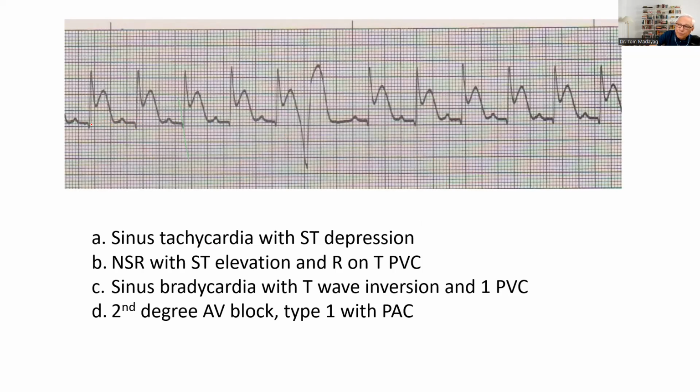But in inspecting the ST segment, we note that this is above the baseline. And again, the baseline is right over here, but the ST segment is right over here, which is a manifestation that there could be STEMI, right?